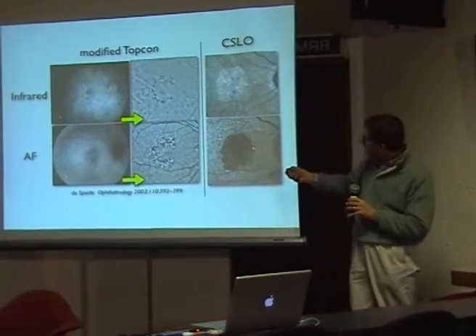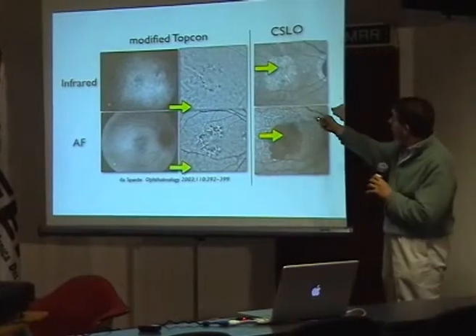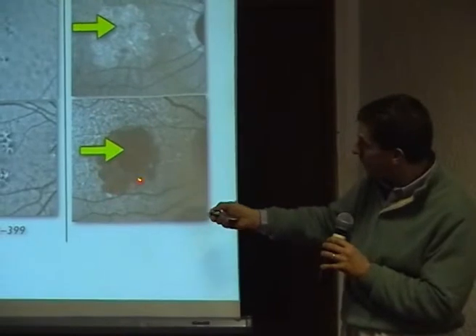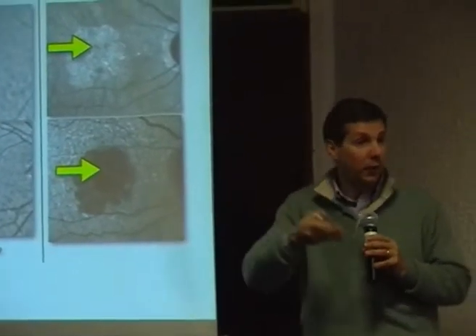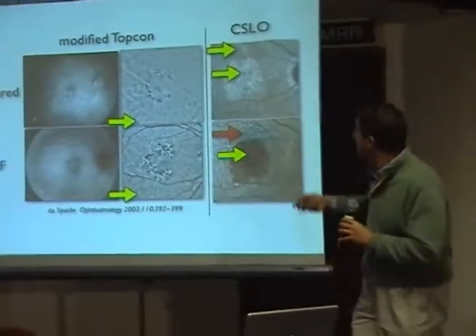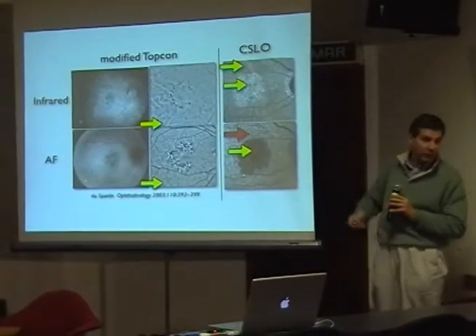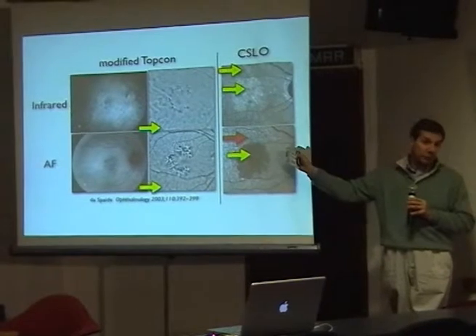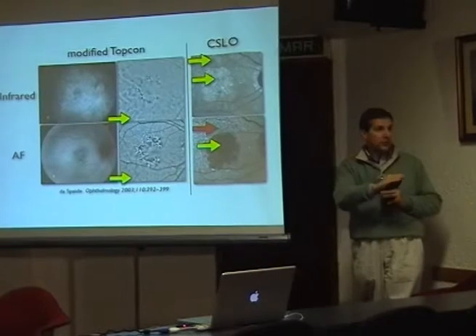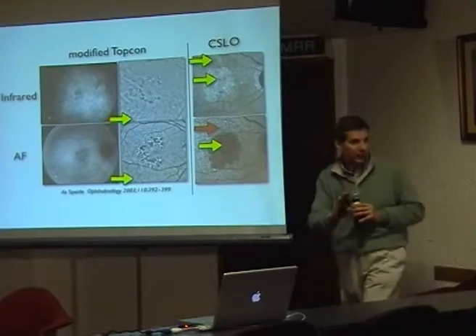And you see that here we see the choroidal fluorescence, but just because we are in the middle of a geographic atrophy, there is no RPE cells anymore. If you look at a normal area where RPE cells are there, you don't see a choroidal vasculature. And that's what I expect from an autofluorescent image that images only the RPE cells. Okay?